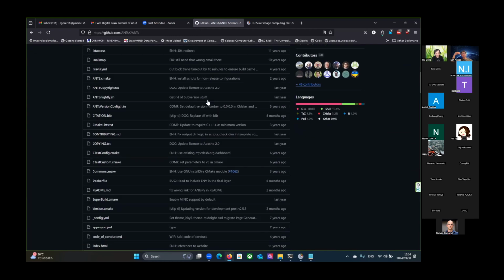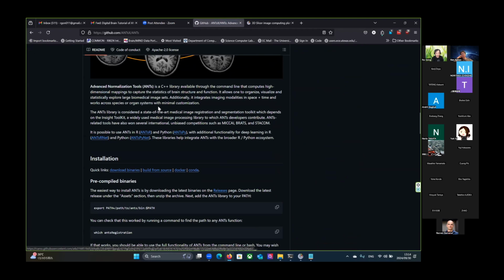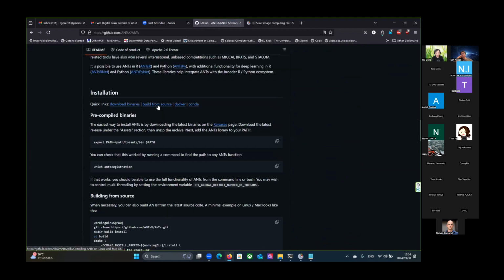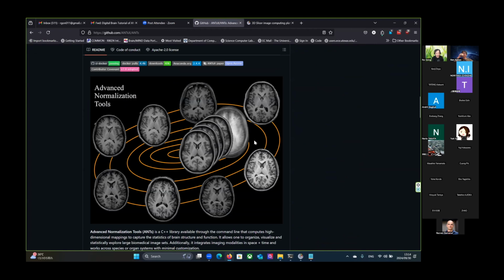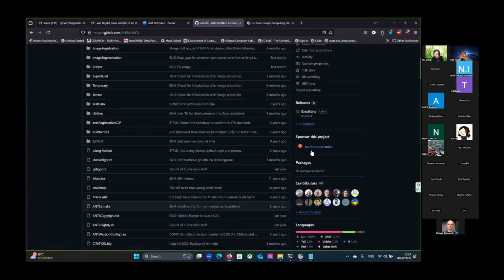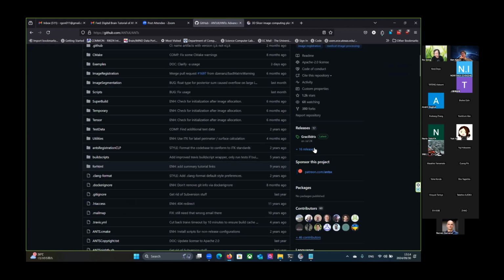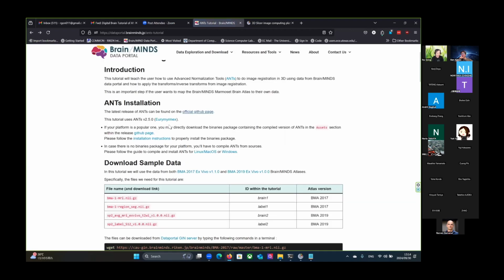Basically, what I did is compile from source, build from source. This will always give you the latest version, because if you're using a downloaded binary or conda, it might be an older version. You can see the current version is from July 24th, so it's quite new. The tutorial is already outdated, you can see, but anyway, it doesn't matter.